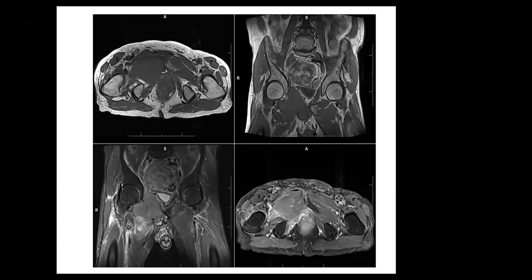So the differential here will be lytic metastasis or multiple myeloma. The third differential will be lymphoma.